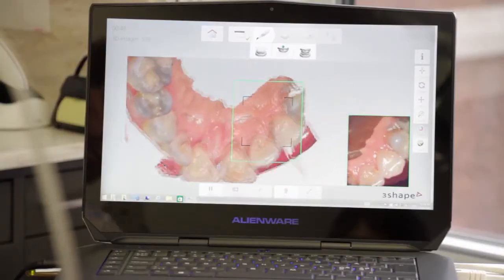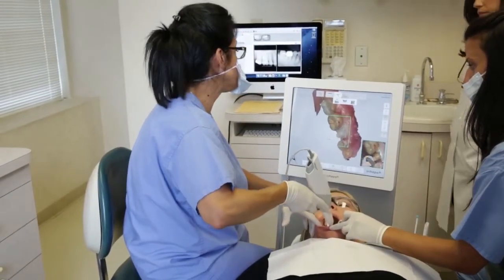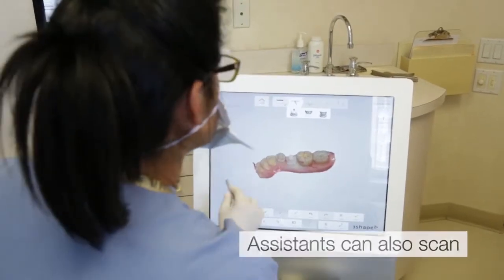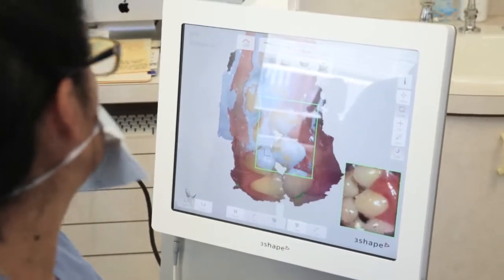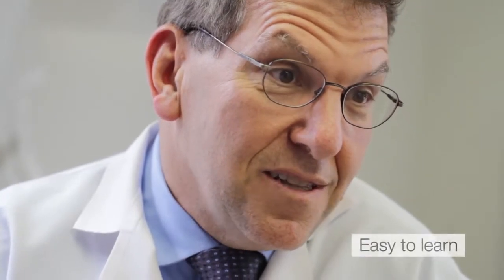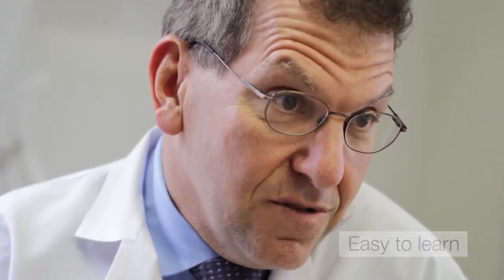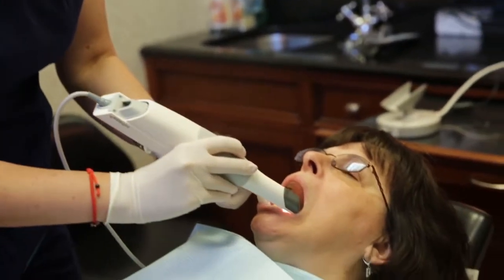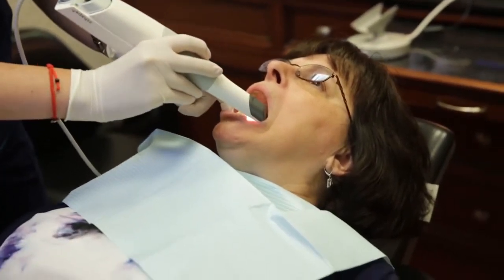It really allows me to have a better use of my time by letting the assistants use the Trios unit. And because the Trios is so easy to use, I can be very confident about them using it. I've used many scanners over the years, in fact most scanners, and I can say for sure that the Trios is one of the easiest ones to learn how to use. Any dentist that has reservations with going digital, if they have a smartphone, they can use a Trios unit that much easier.